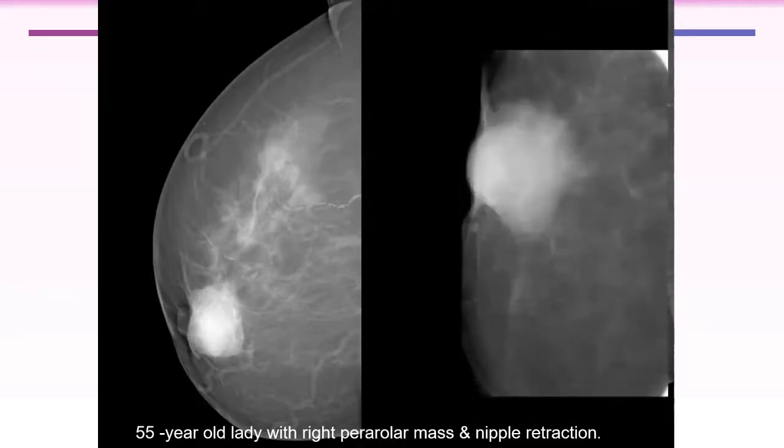Okay. You see, look here. There are flecks of calcifications, and look at the nipple areolar skin and retraction, very obvious in the spot magnification, and the indistinct borders, and microlobulations. So it is a suspicious lesion.